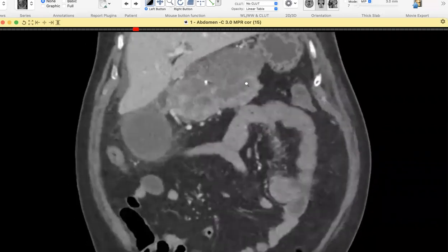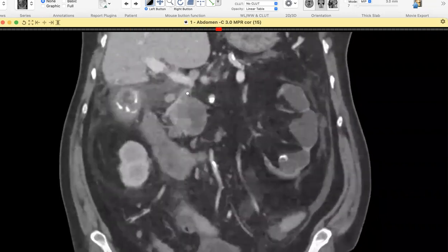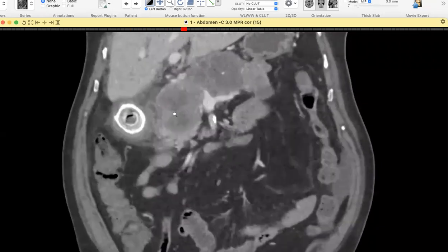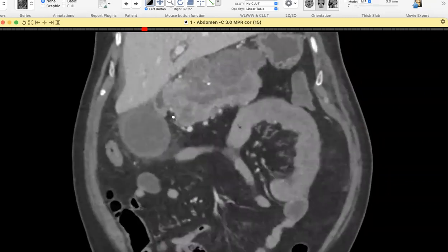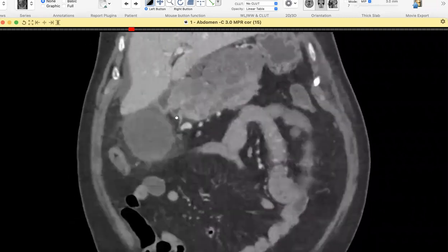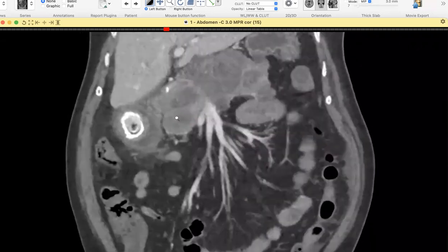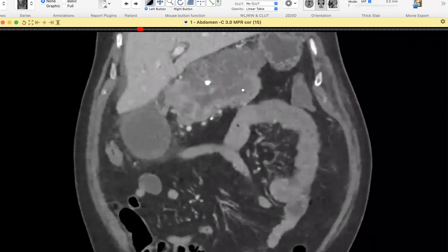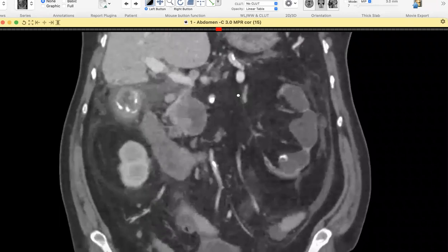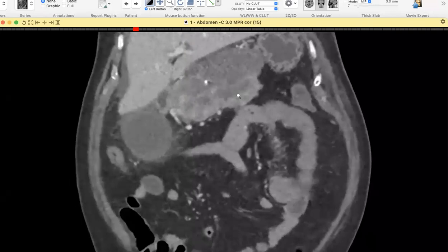And the size of the lesion itself and the age of the patient, all of this, you definitely have to raise the possibility, there are some lymph nodes surrounding it, right? So you'll say this is an IPMN, likely malignant type histopathology, mucinous cystadenocarcinoma type. So I changed my diagnosis from mucinous to IPMN because of this dilated main pancreatic duct. If you see any communication and dilatation, you should change it to IPMN.